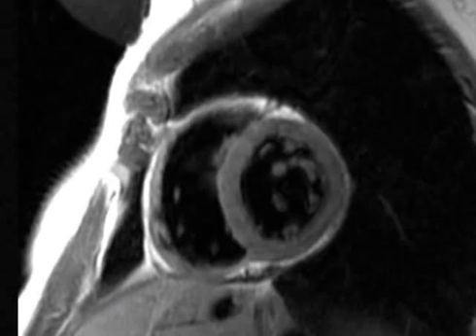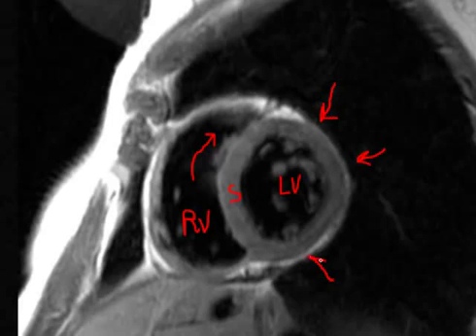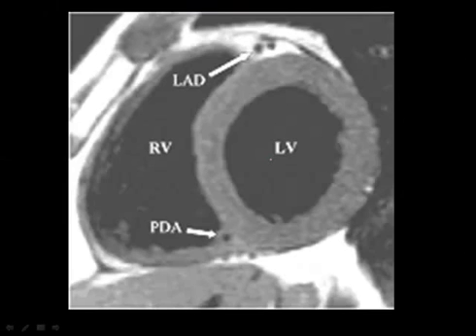And specifically, you're looking at the right ventricle here and the outflow tract. There is the septum, and there is the left ventricle. So really what we're mostly interested in is the state of the myocardium, here versus here versus here. Now the rest of this is probably impossible to try to figure out. Somewhere in here is where the sternum is. So the rest, as I said, it's a double oblique, so don't try to wrap your head around it. It's probably not worth it.